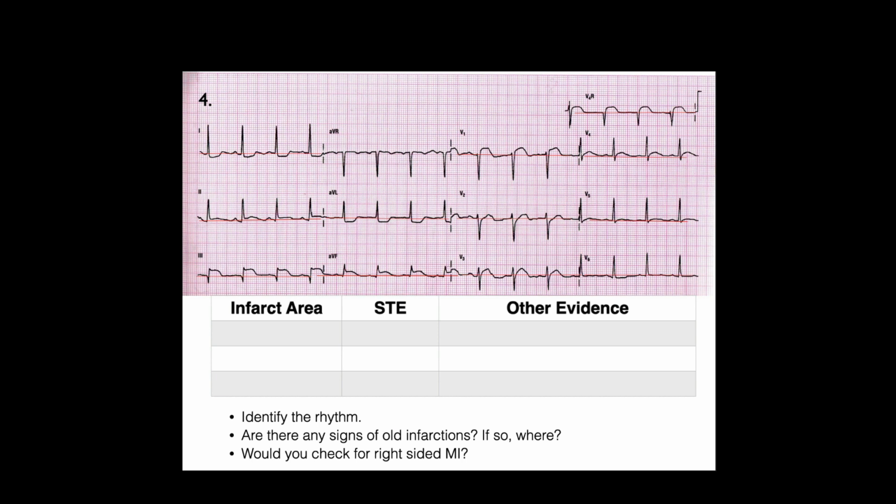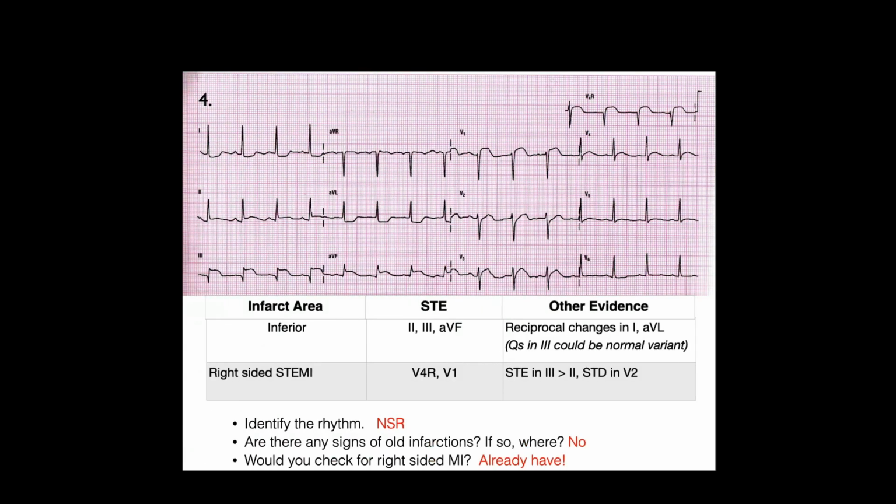Where's my pointer? Hard to say for sure, but if I look at these 3 and say which one is the most obvious, I'd say it's that one right there. Okay? Does that make sense? Yeah. Okay. Yeah, right there.